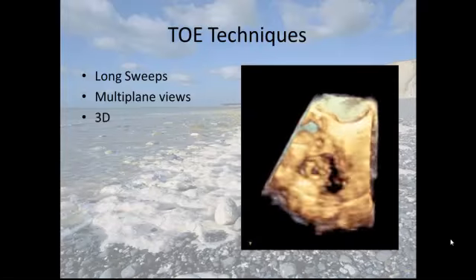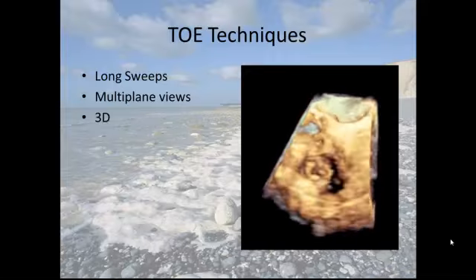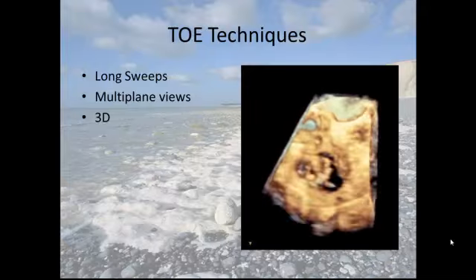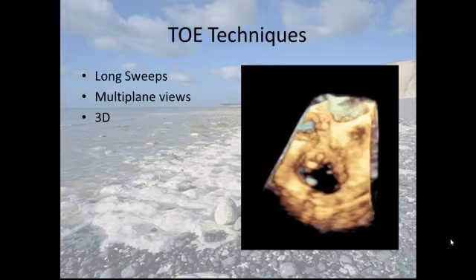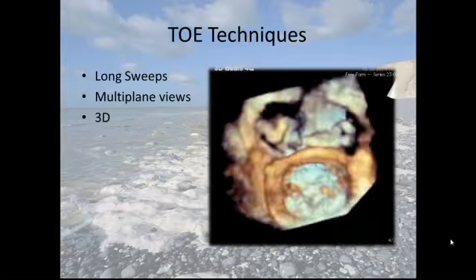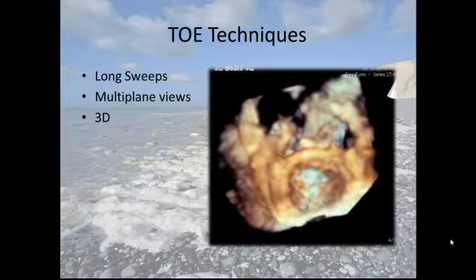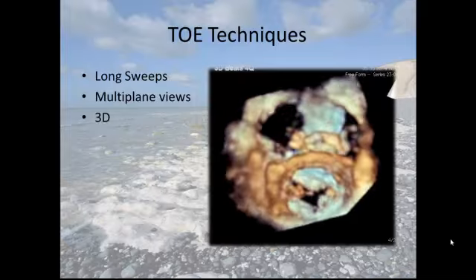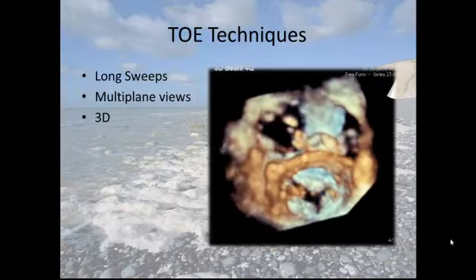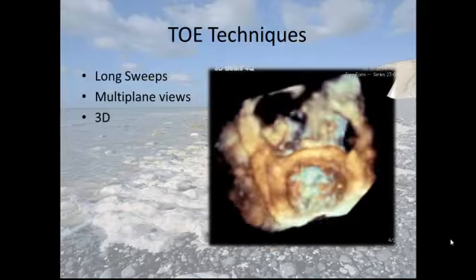So this pigtail disappearing through the pulmonary valve, we're looking down from the pulmonary arteries here through the pulmonary valve, is the remnant of the lead, which clearly wasn't a huge success as a procedure, and you can see that curling around. But if you look at the entire 3D picture, you can see the left side of the heart here with the mitral valve, but you can see this lead remnant on this side going up the pulmonary outflow tract, and here you can see the vegetation on the right, going up through the tricuspid valve. So 3-dimensional echo can also be really helpful in trying to sort out some of these conundrums.